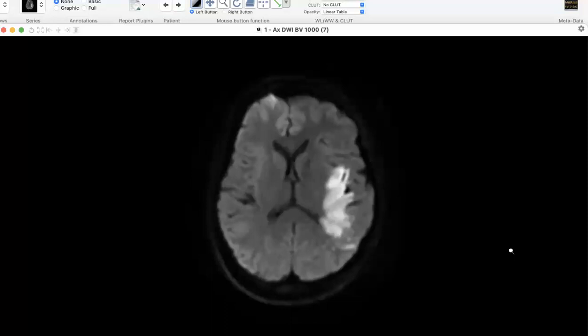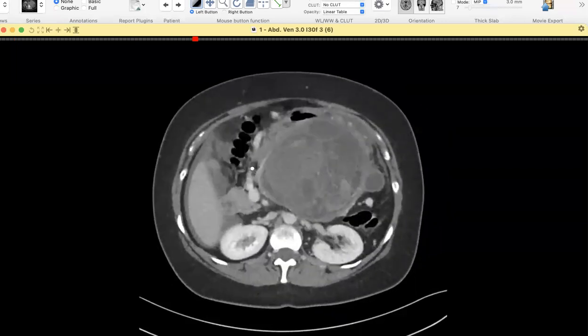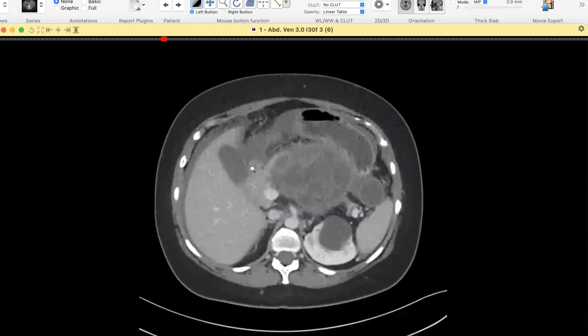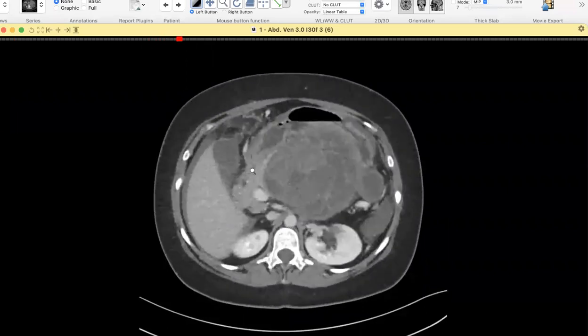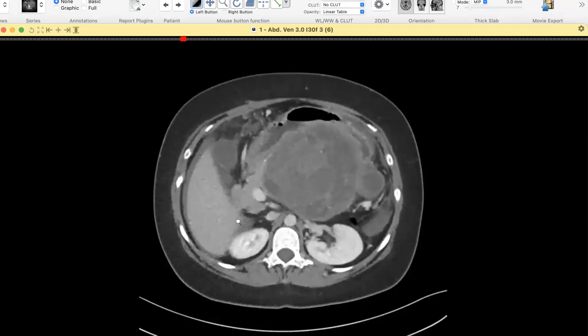So I put the last case in just as a revision, because normally you hear and then you forget. It's actually mucinous cyst adenocarcinoma. Remember, when you say cystic neoplasm, they are looking for a little deeper than that. They just don't want to hear a general differential subheading. They want a proper diagnosis. So your description was spot on.